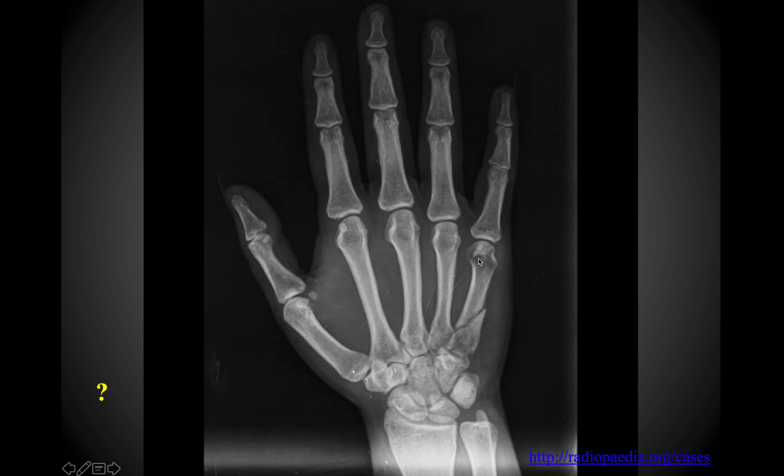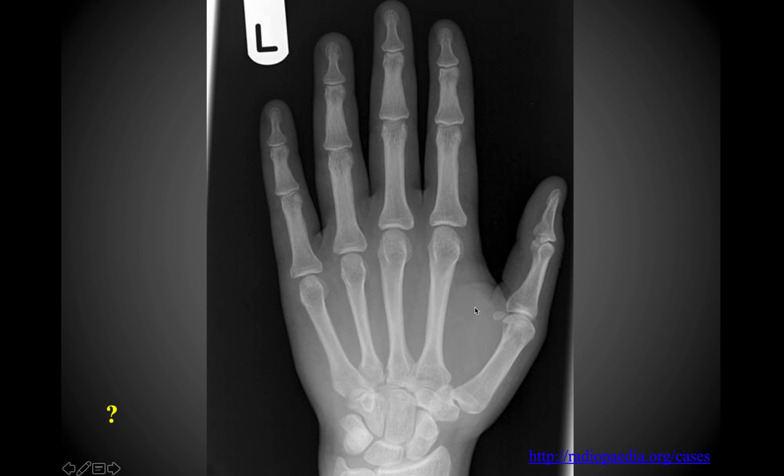All right, so this one shows a relatively obvious deformity, once again in the fifth metacarpal. So you can see here where there's approximately a mid-shaft fracture of the fifth metacarpal. All right, and so if you look at this image, take a moment and see if you can find any abnormalities.